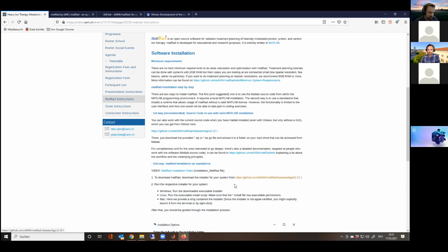And you might already have an installation from the masterclass, if you participated in a masterclass for school children or for students already, like a one-day course, you might have a version. We do not want to work with this version because it simplifies some stuff. It is meant for school children and therefore might simplify some stuff.